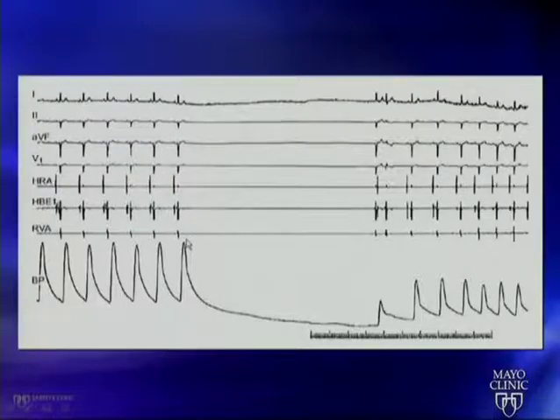In a tilt table test, for example, if it was done and you had intracardiac tracings, you could have a period of a sinus pause, but when there are sinus beats or you're pacing the atrium, you'll also get block across the AV node. So a good rule of thumb is if you have tracings, Holter, EKG, intracardiac, that show both sinus slowing and AV node block, Mobitz 1 type AV block, there's some issue with the vagus. So in the setting of, say, neurocardiogenic syncope.